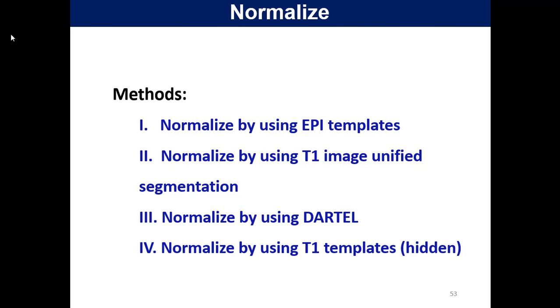But this one is hidden in the graphical user interface. You can use code to call that. And the most used is normalize by using DARTEL.